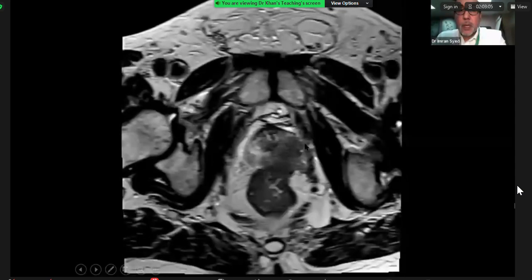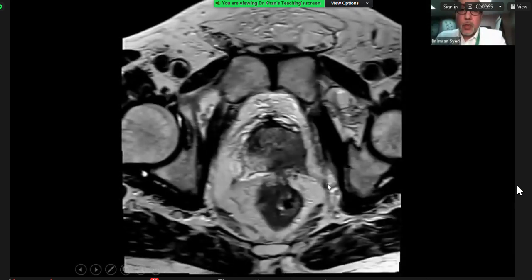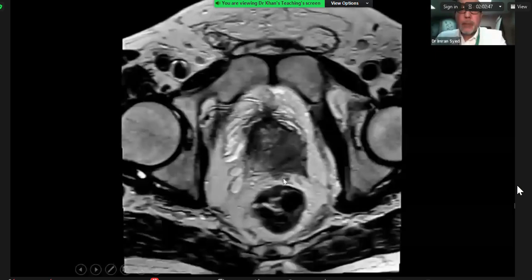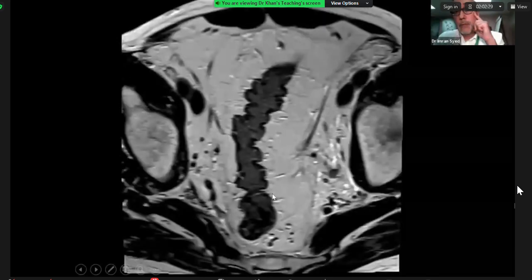There's a tumour, low signal change, and look at the proximity of the rectum with the posterior aspect of the prostate. There is tumoral extension seen laterally, posterolaterally on the left side, and there appears to be thickening and nodularity crossing the anterior mesorectal fascia. Also, you can see this appearance here, where there's eccentric, curvilinear thickening on the left-hand side. So we need to see whether there's any visceral invasion of the bladder neck.